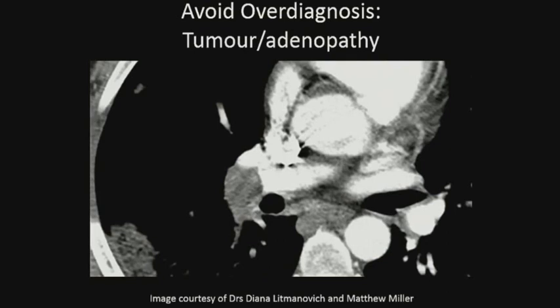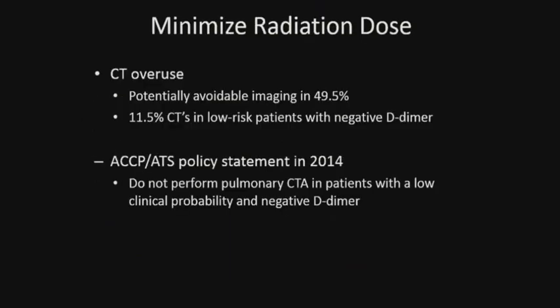Tumour involvement of the pulmonary arteries can mimic pulmonary embolism, as in this case, and PET-CT or contrast-enhanced MRI may help differentiate between tumour and intraluminal thrombus, where there is debate.